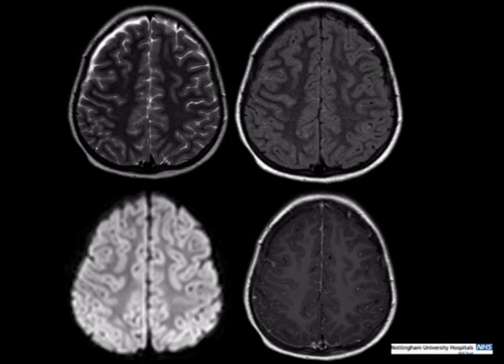But if you look at the axial FLAIR imaging up here, you can see that in the sulci over the convexities bilaterally, normally you would expect the CSF to invert and be low signal there, but it's high signal. So this is abnormal CSF signal. Again, post-contrast doesn't really help you that much. This was a partially treated case.